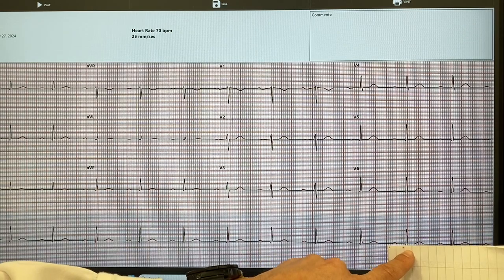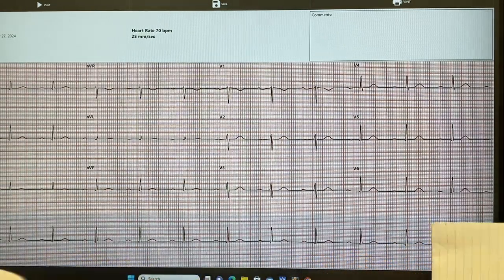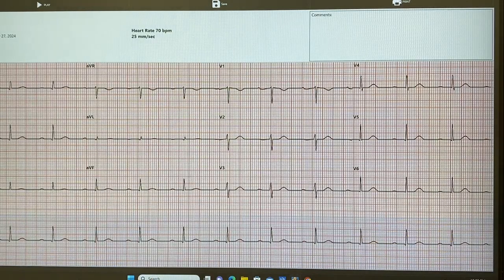Good job on being thorough. He's going through all of them, all the way to the end. You'll never know, you may catch one that's not the same. They are consistent. They're consistently prolonged, and that's a criterion for which degree? First degree. Oh, sorry, Mobitz is second degree. So first degree. Okay, so what's our problem?